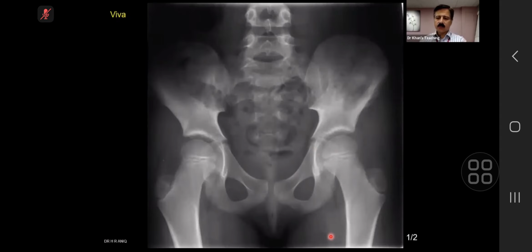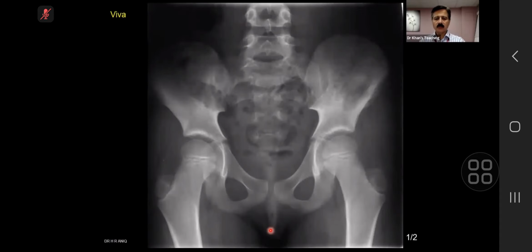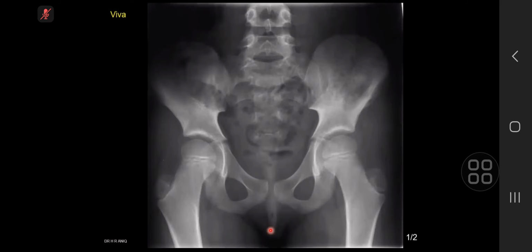Another observation film, I think the second last of the day. Over to you. So in the lateral iliac crest, there appears to be increased. Which side? Left side. Okay. The iliac crest. So in the iliac crest, compared to the contralateral side, there appears to be a periosteal reaction or cortical irregularity.